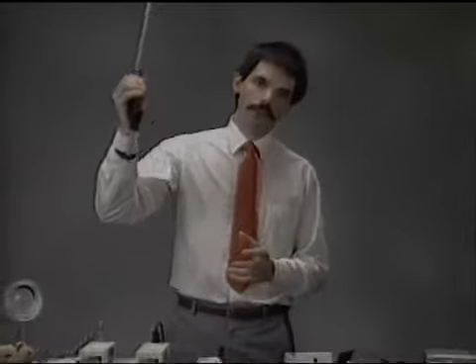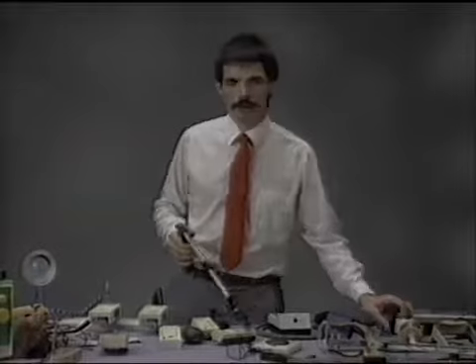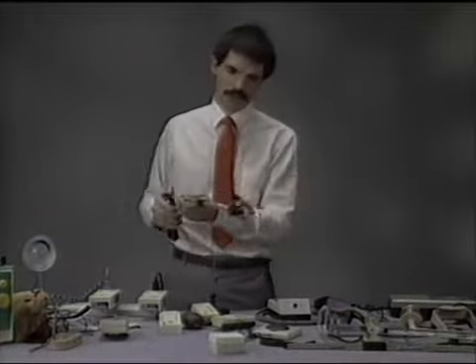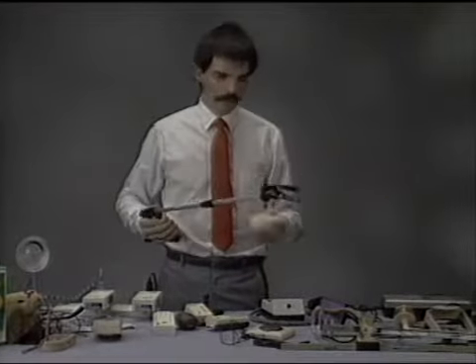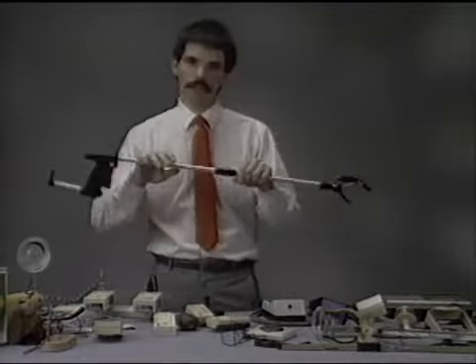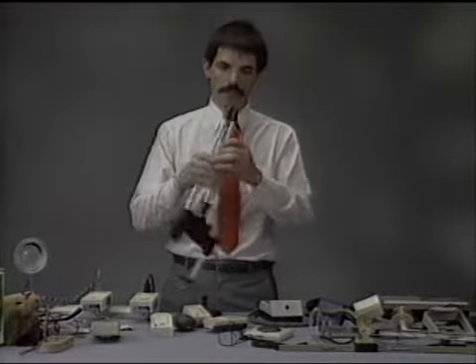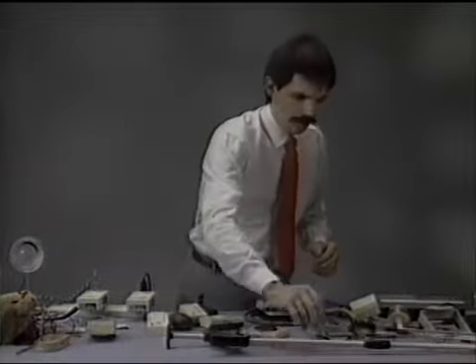And a reacher is designed to allow someone to either pick something off a very high spot or something off a very low spot. For example, if you drop something out of your wheelchair and you can't reach down and pick it up, it's nice to have a reacher like this and just grab hold of it and bring it up to you. Now most reachers, and they come in a lot of different shapes and sizes, collapse so they can be very compact and put in the back of your wheelchair. And they come in a lot of shapes.